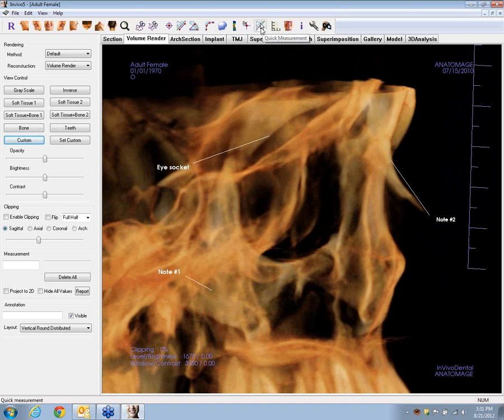We have a capability of turning on and off this quick measurement. When we have the quick measurement turned on, the reticle will pull into place no matter what your magnification is. 20 millimeters of span here so that we can get a quick little measurement wherever your cursor is. You just turn that off by clicking the button one more time.